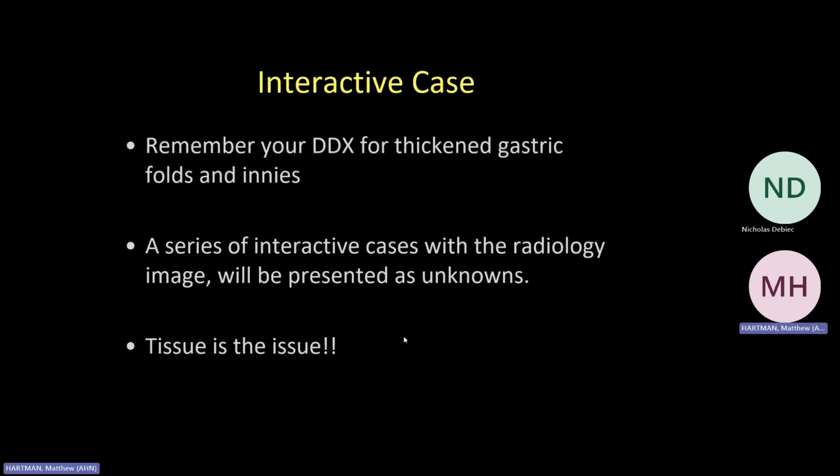So let's do some interactive cases. So remember your differential for thickened gastric folds, and remember tissue's the issue. It's great to come up with a differential, very hard to actually nail the actual diagnosis. Our goal is to get a good differential and make the finding.